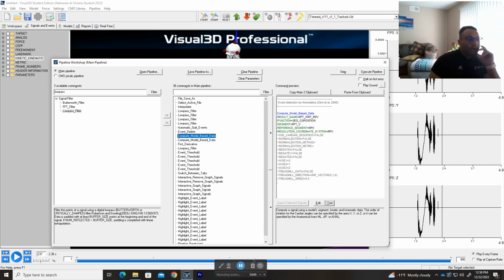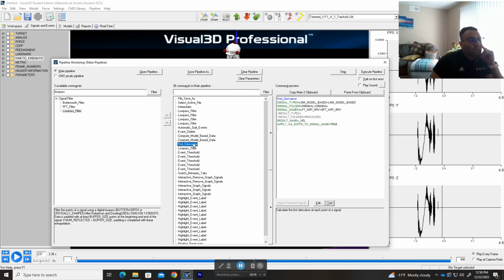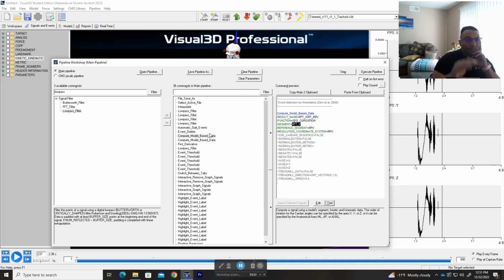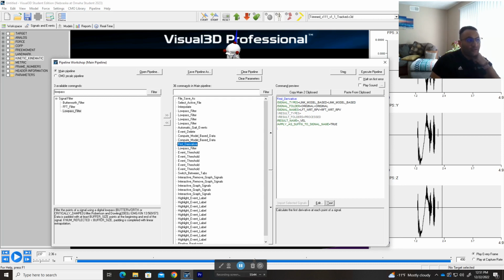So first of all, we needed here to create the velocity of the right foot and the velocity of the left foot, and we use the first derivative. So we extract the position of that here. So here segment position right foot virtual. So we're using the actual ground one. I prefer to use that because it's actually on the ground. If you remember, we basically just change the z coordinates to 0, but keep everything else the same. So we extract that position, and then from that position we create the first derivative.